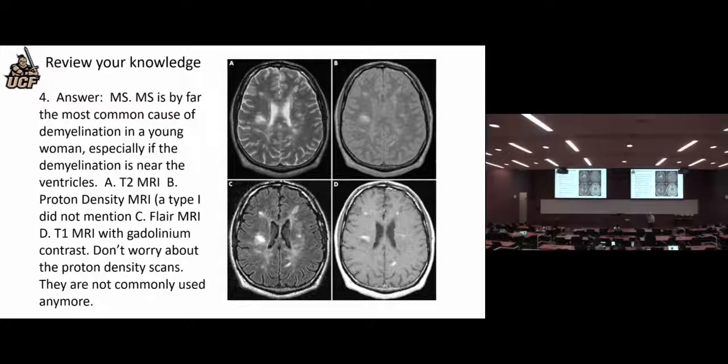in allowing you to diagnose MS from a single scan. That's possible now, because you used to have to be able to show at least one relapse, basically 2 attacks. Now you can actually do that in one scan. If somebody comes in with an attack, you do a scan and they've got some old lesions like this and like this, and then they've got some newer lesions corresponding to the current attack.